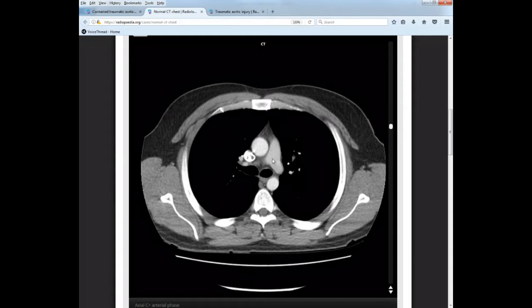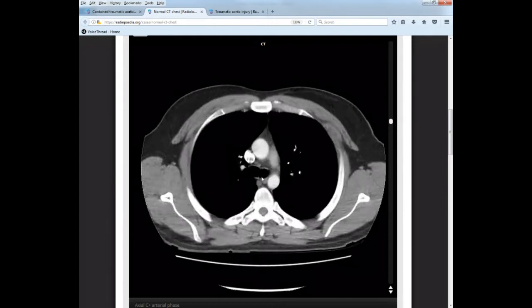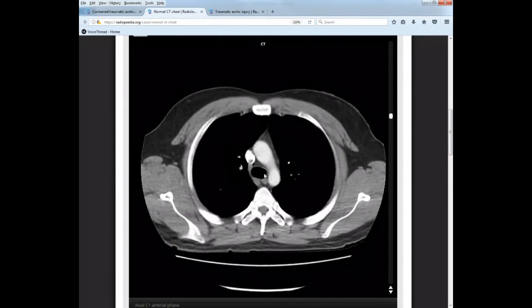So when we put a circle there and it measures the Hounsfield units, when it is at a certain threshold, that's how we know that the contrast has properly opacified this vessel to be able to initiate the scan, so we can visualize this vessel full of contrast, so we can look for any filling defects to see if there's an embolism. So looking for the carina is going to help you to determine the proper level for that.